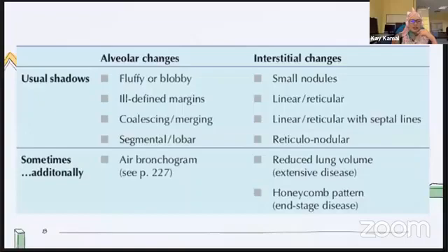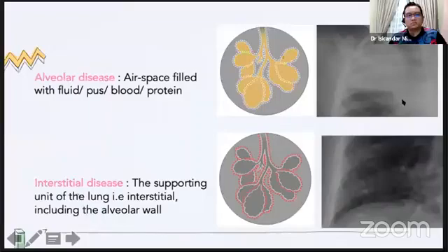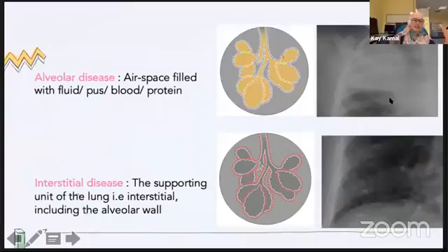But nowadays I notice, maybe together with the development of happy hypoxia patients, that even when the patient looks not too bad, when you look at the X-ray, it is very messy. This is my experience seeing the changes in COVID patients nowadays. Once upon a time it was just patchy and sometimes you really had to strain your eyes. Nowadays you don't have to strain your eyes. You just open it and it's staring at you. And many times nowadays we see the diffuse type.